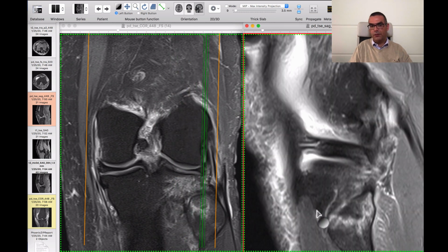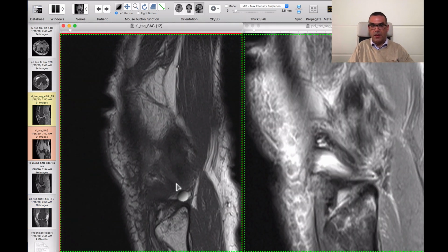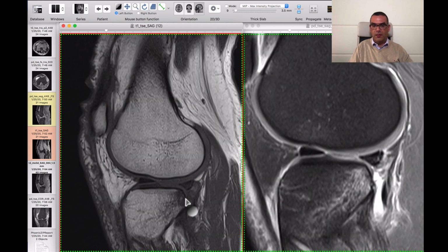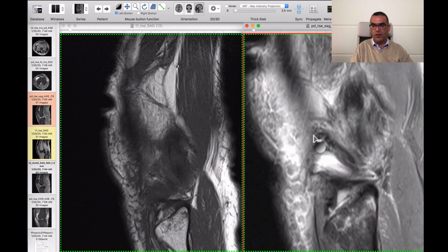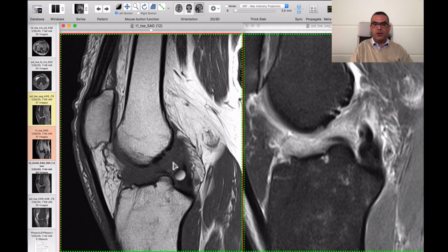And this looks like a fracture, and we will have to just get the T1 to help us to see if this is actually a fracture or not. You can now see there is a fissure fracture at the fibular head, the tiny compression fracture at the posterolateral corner of the tibial plateau, and the marrow edema and tiny trabecular compression changes at the lateral femoral condyle. So in this case we have the full-blown picture of the ACL injury.